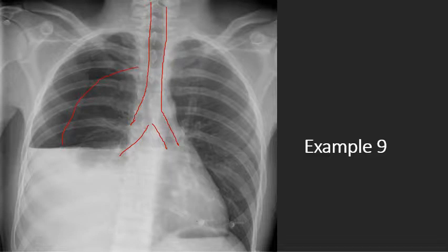And if you didn't see that right away, that's okay. But in your mind's eye, I'll erase this. I need you to look at this for a minute. Here's the line. Here's the pleural line right there. And so another huge thing, just like we saw with the last x-ray, is that I cannot appreciate anatomy on the right side.